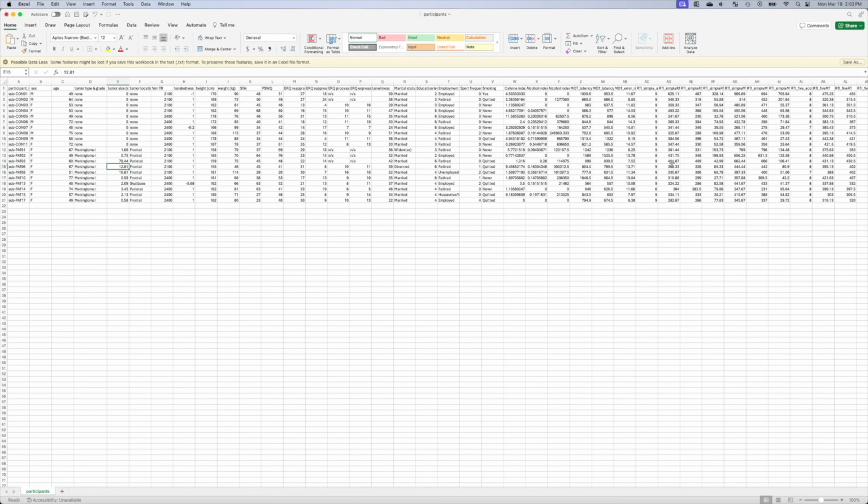Now, there's data within here that we want to pay attention to, because this is going to be important for processing the data. So this data set very nicely has this fMRI TR. That is the repetition time, and this is something that we're going to use. So we'll come back to this, but this is in milliseconds. So this would be put in as 2.1 or 2.4 seconds, but these are milliseconds, and this is something about the scan itself that we will need to put into the pre-processing, and we'll show you in a little bit. So we'll come back to that, and that's important.